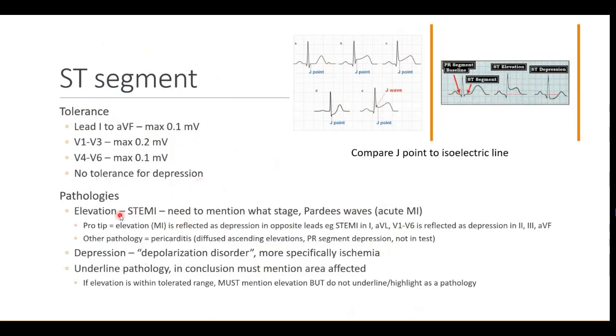Oh yeah, I had to mention for the elevations that they will be STEMI, which is an ST elevation myocardial infarction, and you have to mention what stage, which I will explain in the next slide. And then there's a special mention of Pardee's waves. You also have to mention what area is affected.